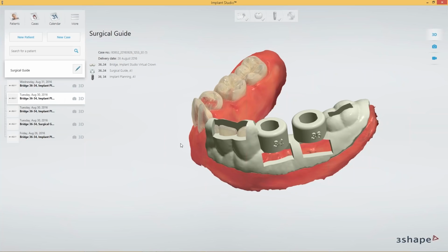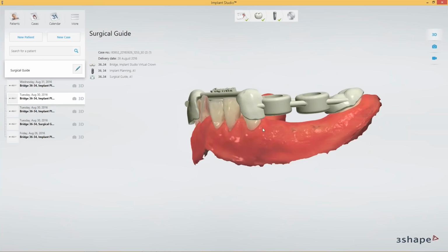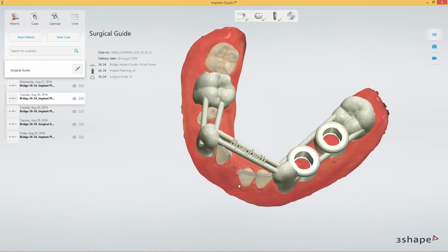Going to the next one, it is a bit different, and it's what I call the spaghetti guide. Actually, we discussed it earlier today, and we create it al dente or super al dente, because it's straight strings. Nevertheless, it does exactly what we want. It's going to secure a stable guide, rigid, not bending, making sure the surgeon can perform the surgery the way he likes it.